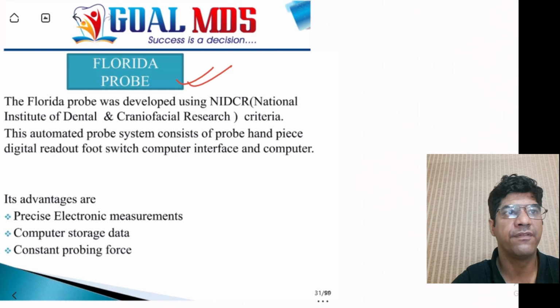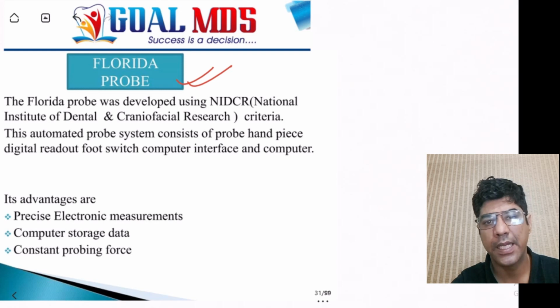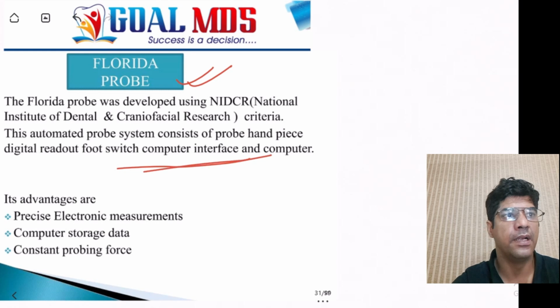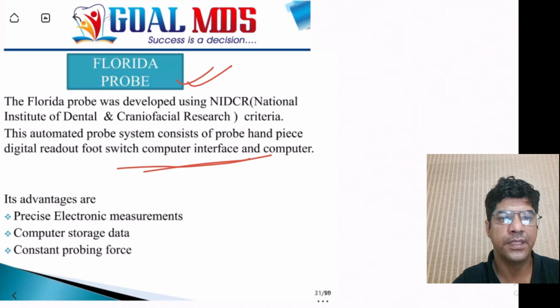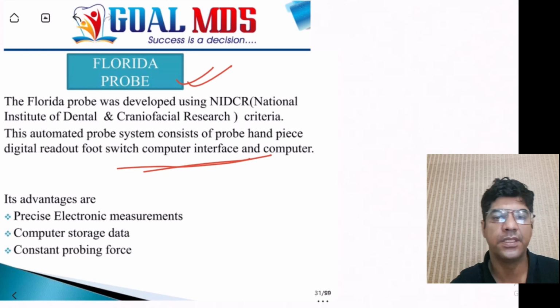The other is the Florida probe. It is an advanced dental tool used for periodontal charting and assessment. It is a computer assessment system that enhances the accuracy and efficiency of measuring the pocket depth. It combines a hand-held probe with software to create digital periodontal charts.